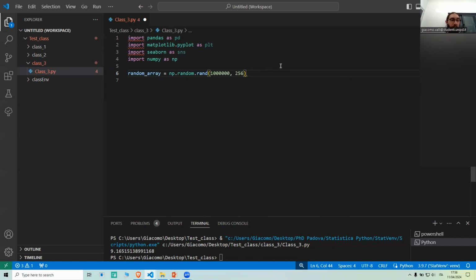Well, for example, this is an array of a fatiguing contraction lasting 7 minutes with a sampling rate of about 2000 Hz, so very common in EMG studies, with 256 channels, which are also typical in modern EMG grids, or at least are becoming more and more common.